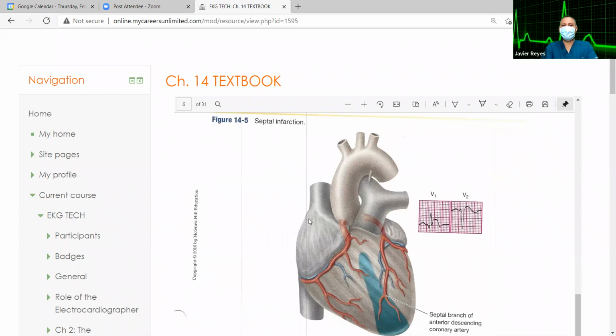It's there, guys, right next to the number. So we have to zoom out. A lateral. Lateral. Where is it happening? Point in your body where it's happening. On the left side of the heart.